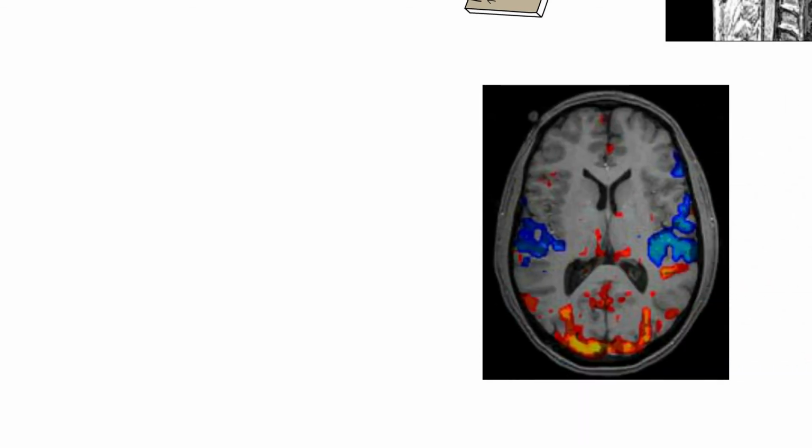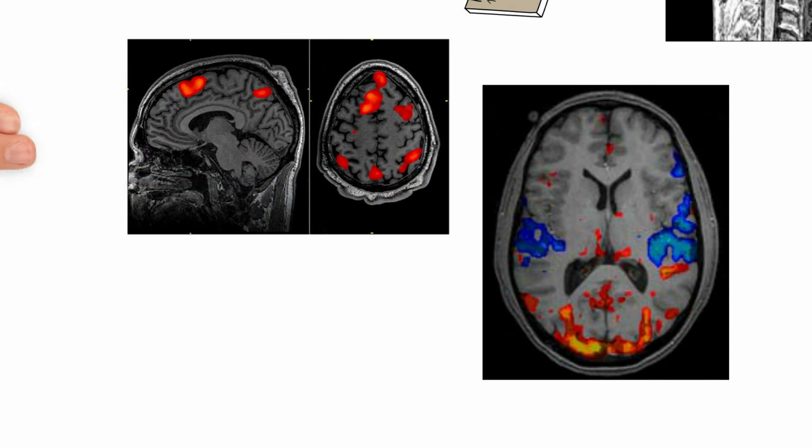This is a colorized image of the activity of the brain, with red being most active and blue being the least active. In this scan, the person was shown several pictures to look at, so the active area was the occipital lobes. This image is an fMRI of a person using their working memory to solve a problem. Both the parietal lobes and the frontal lobe are the active areas in this process.